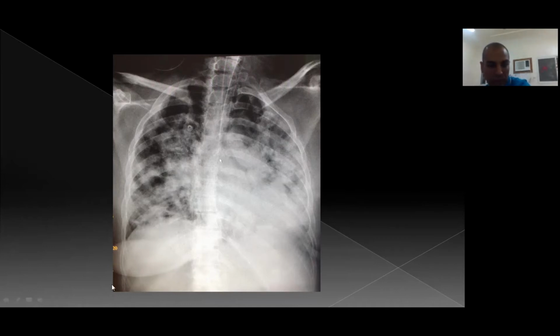Here we have the right breast shadow, while on the left side we don't have a breast shadow. We have a left mastectomy for previous breast cancer, so we can put metastatic lesions before infection. But by the way, we don't have a final diagnosis for this patient. Maybe infection, maybe metastatic, but the breast shadow is one of the most important parts to see.